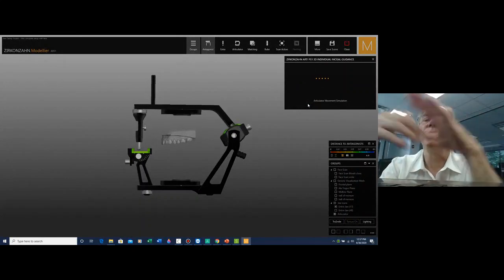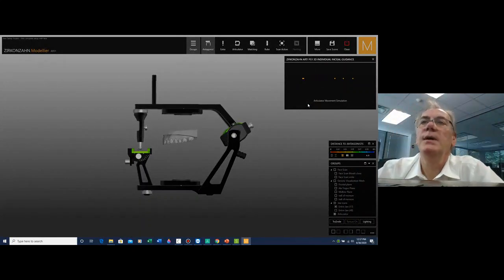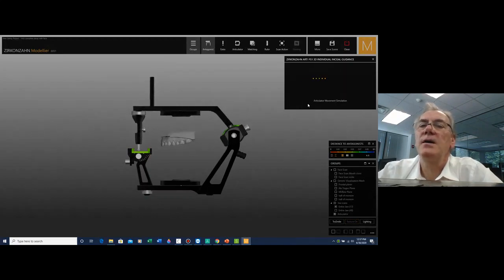So this is basically the procedure that we need to go through, step by step, tooth by tooth, evaluate where the contacts are, start eliminating them, and at the end evaluate how much biological material we need to eliminate in order to get a clear movement. If it's worthwhile taking away, if it's necessary to add, if it's something that we need really to evaluate and go through an ortho procedure and so on and so forth.